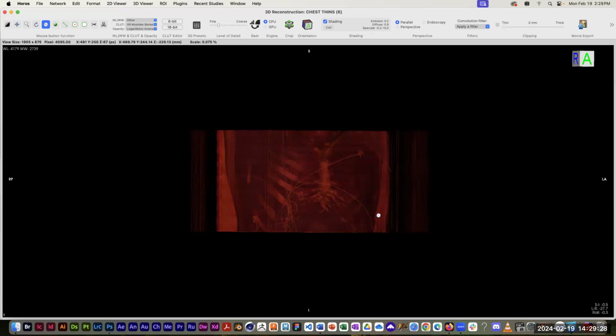So it flips it upside down, but it actually makes it a mirror image. So the heart was on this. So the heart would have been on the right. Okay. And if I had actually visualized it in such a way to see something like the aorta, then I would have known for sure, okay, this is just dead wrong. I mean, my first instinct when I'm seeing fractures on the right and the radiology report says on the left, I'm thinking that the radiologist just screwed up.